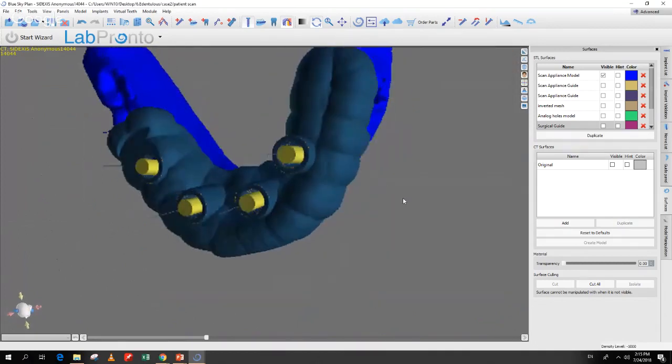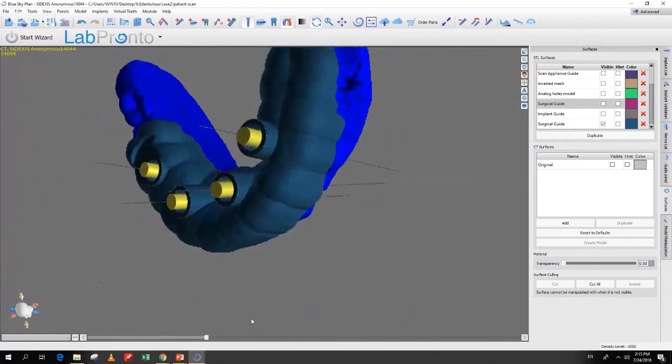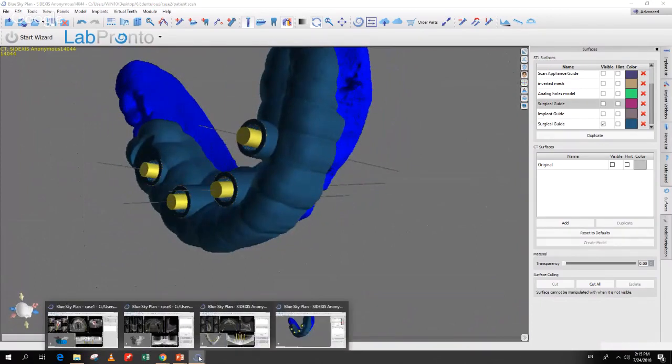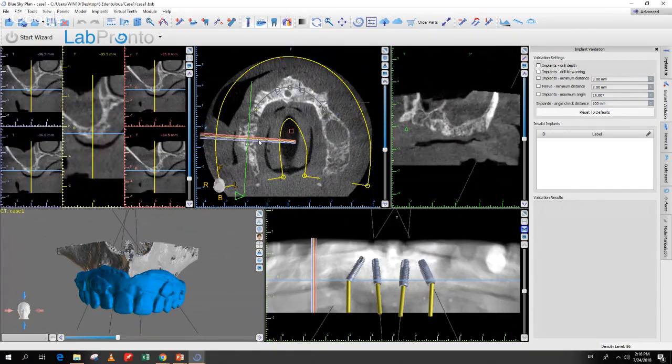Okay, so after we've created our long list of surfaces and did everything I think we could do with this case, we're going to switch to another case. The main point of this case is to demonstrate two functionalities. The first one's actually not a functionality, but a point that we've discussed until now.